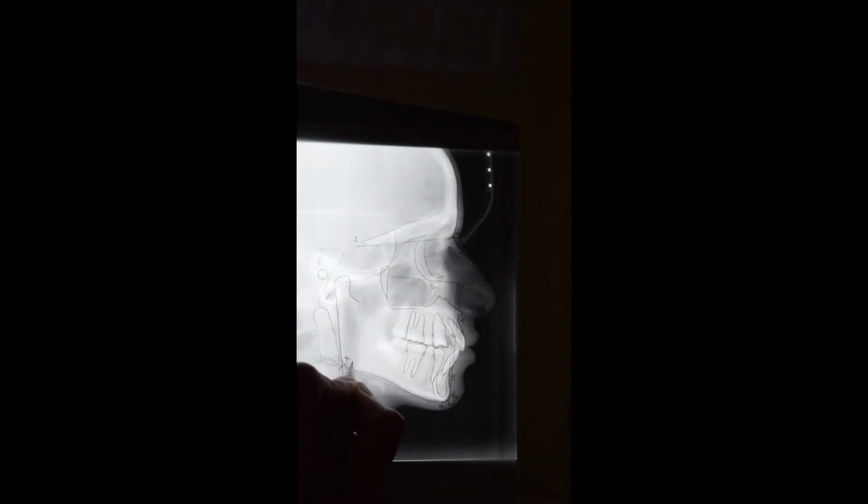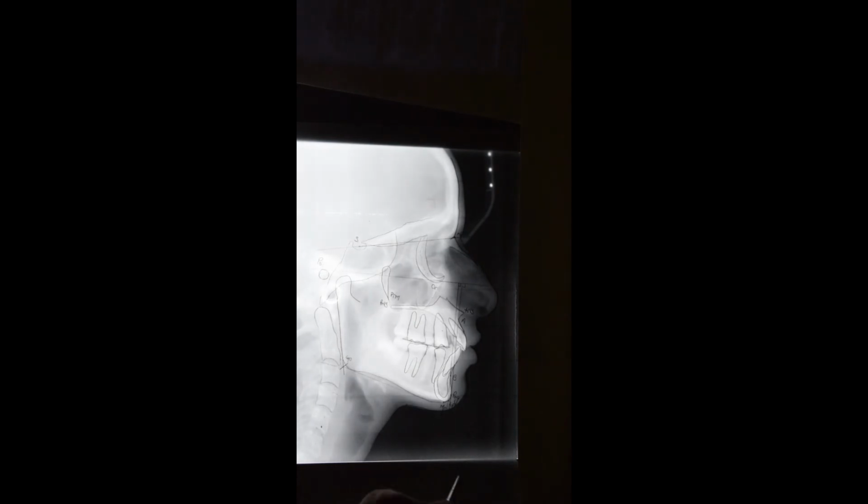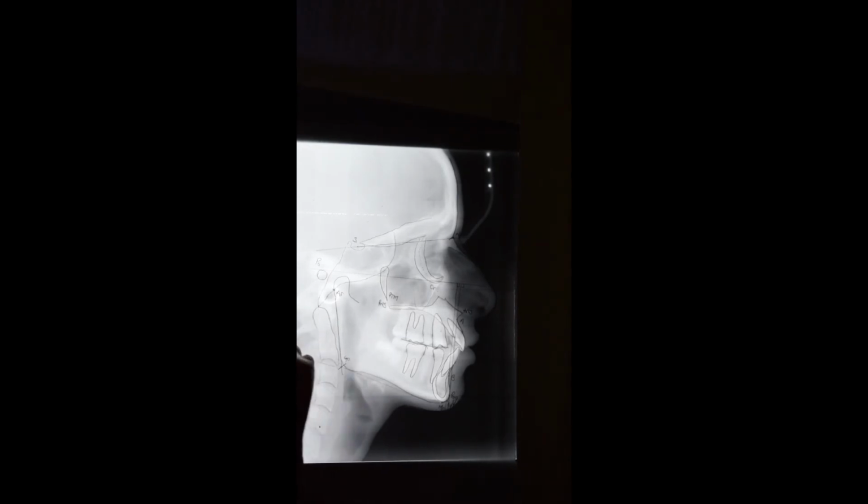Right? So this is the point nasion, the sella, the orbital, the porion, gonion, or the angle, gnathion, menton, pogonion, point B, point A. This is the anterior nasal spine, or ANS, the posterior nasal spine or the PNS, and then we have the PTM point or the pterygomaxillary fissure over here. And over here, where the sphenoid bone is making contact with the condyle, this is going to be called the articulare. This is the point basion.